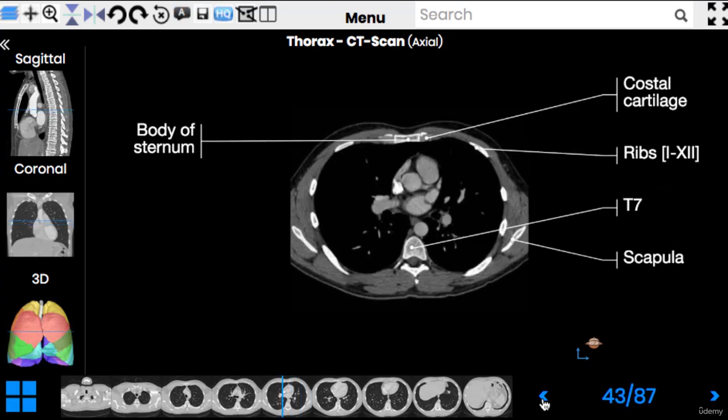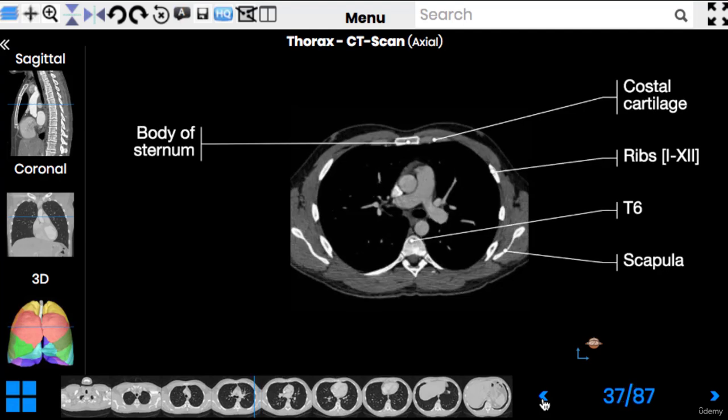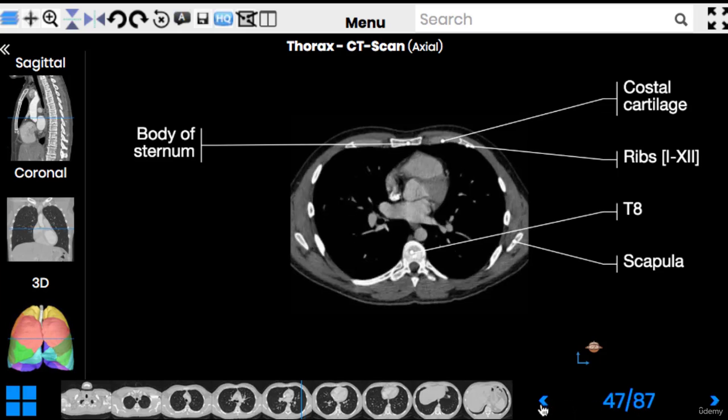Okay, let me scroll up again to show you what else happens here. Just in front of the left atrium, you can see the origin of the ascending aorta, and you can even identify 3 cusps of our aortic valve. Do you see this tiny line in the middle which subdivides the orifice into 3 cusps? So here they are, the cusps of the aortic valve.